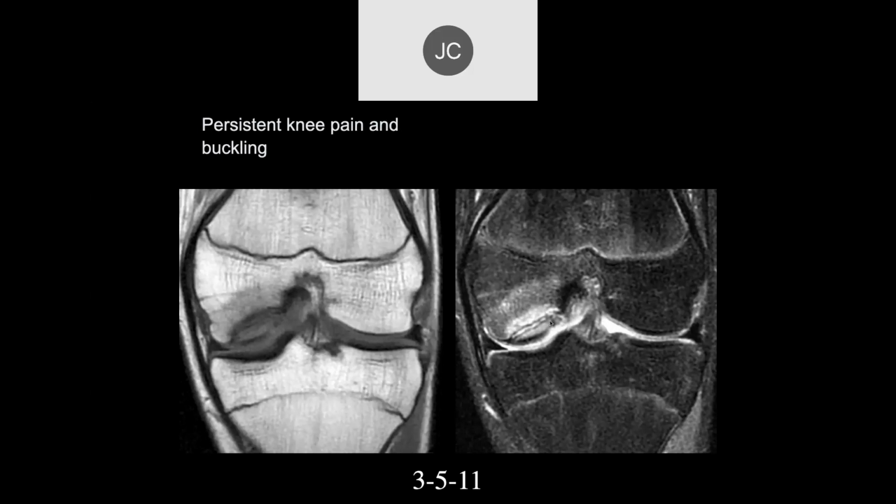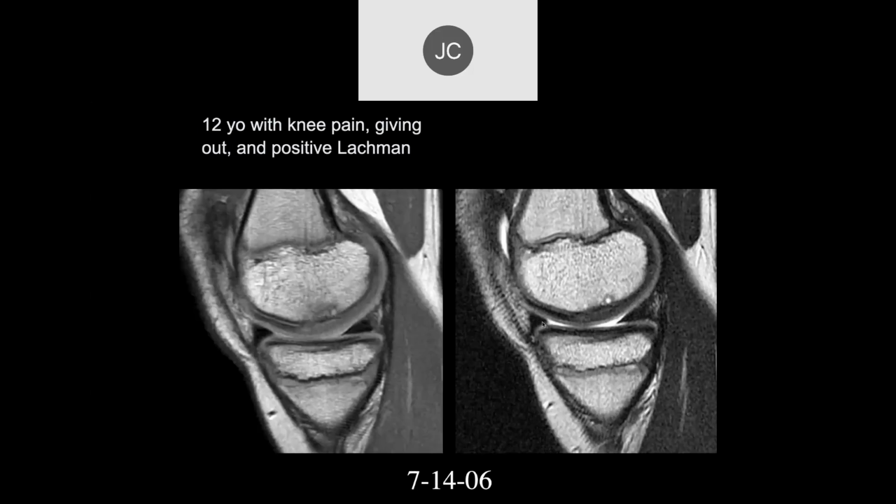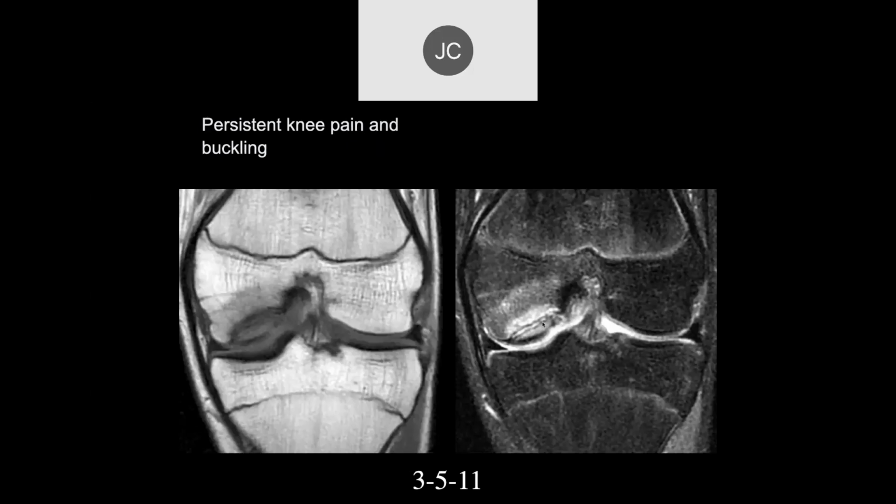So nowadays, this was called osteochondritis dissecans. There's a big debate about what this is due to. All of the cases that we've been able to follow over time, and we've seen a few of them now, look just like this. They start out with a subchondral fracture, and the kid continues to play and doesn't allow that to heal. The fracture becomes larger and larger. Then you get an unstable fragment here, and eventually this will lead to a full osteochondral defect in that area.